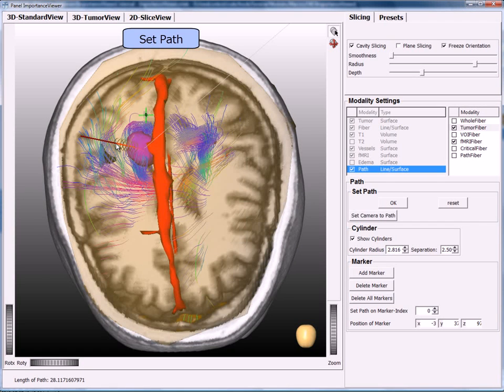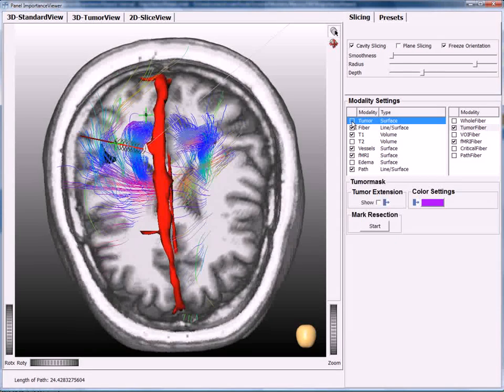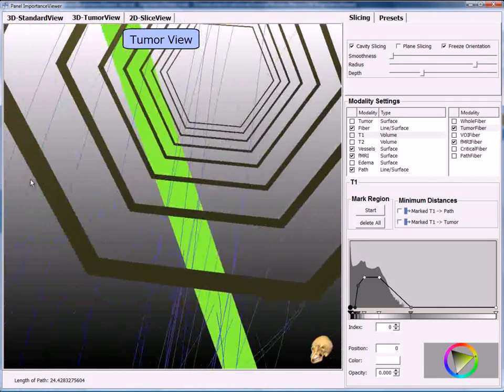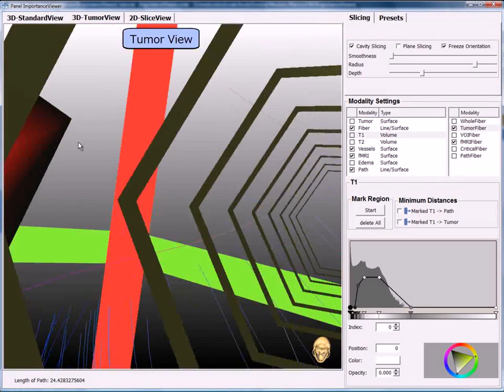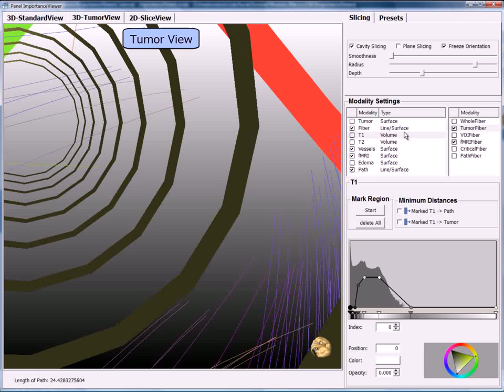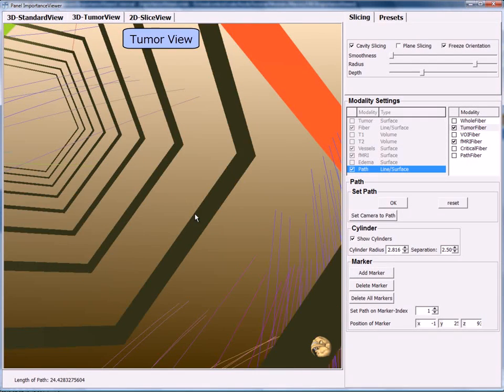To evaluate different path settings for finding the most adequate access, markers can be set. Defining the entry point of the access path on a 2D projection of the skull comprises ambiguities and weak precision. Therefore, an innovative separate view from inside the tumor center is given. Looking from inside the tumor, the user can see all properties of the brain that lie between the head surface and the tumor itself. In addition to the orientation guide visualized as a skull, 3 orthogonally oriented rings colored in blue, red, and green provide better orientation to the surgeon.